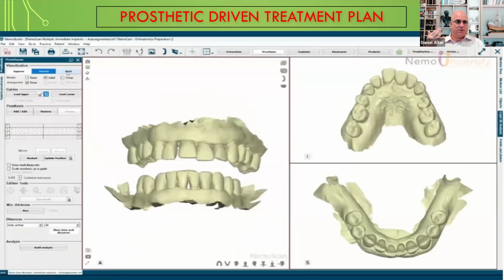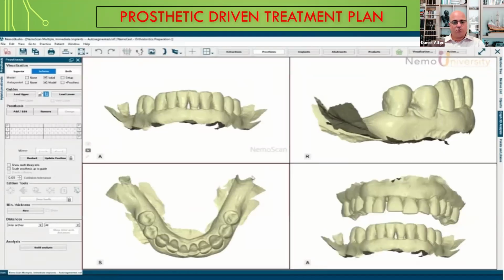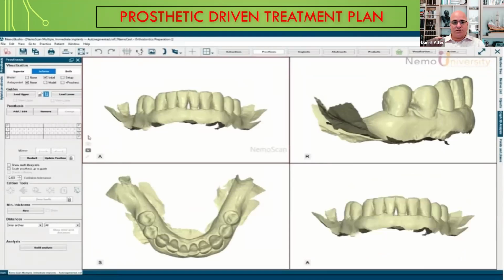Obviously, with the sinuses, you don't want to perforate them because that's a whole host of other issues. So when we place that implant, if you get too close where it may compromise either the mandibular nerve or the sinuses, it's going to turn red rather than green, indicating that you've gone too close to these anatomical structures, and to back off of it.